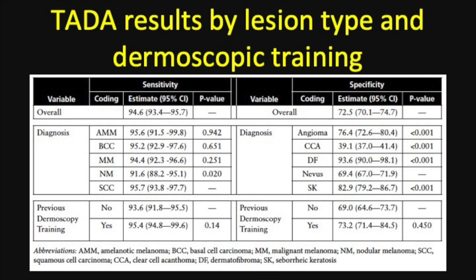It's not true. We did not allow the experts to exit the algorithm on purpose, right? So, for example, this is meant to have a high sensitivity with a sacrifice of specificity. Give you an example. Clear cell acanthoma. You will immediately recognize a clear cell acanthoma because it has this string of pearls-like vessels, right? Ah, that's a clear cell acanthoma. However, in this algorithm, it would get biopsied, right? Because it's organized with those vessels, it's going to come off.